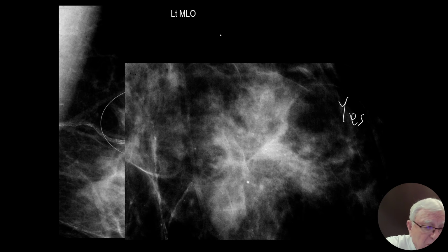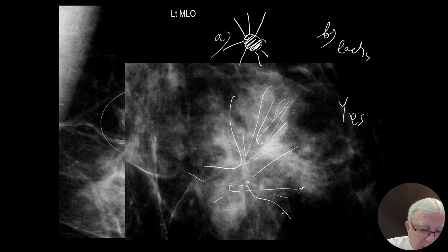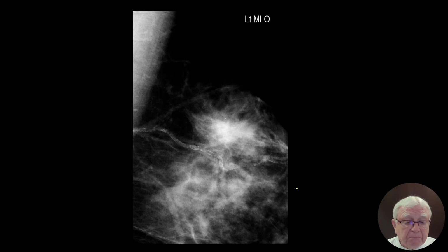But then when we learned the analysis tricks of anything that is radiating, you look at the central tumor mass, which lacks here. There is none. This is cancer, the white star. And then look at the Eiffel Tower, which lacks here. It's kind of catch me if you can. I cannot say it's not a radiating structure, but I don't know what to say. Well, I would say give a chance for radial scar.